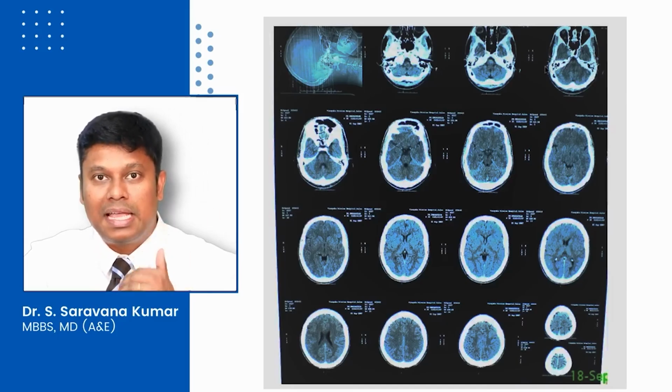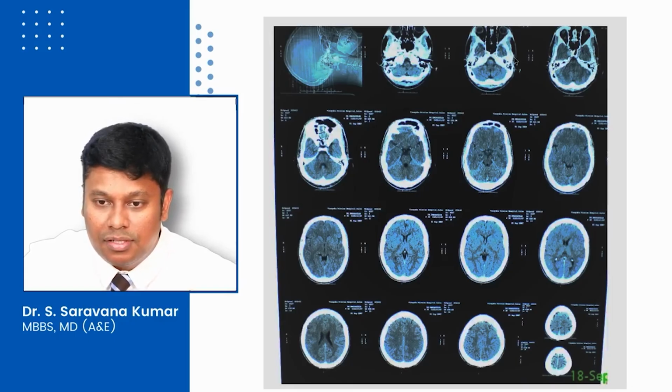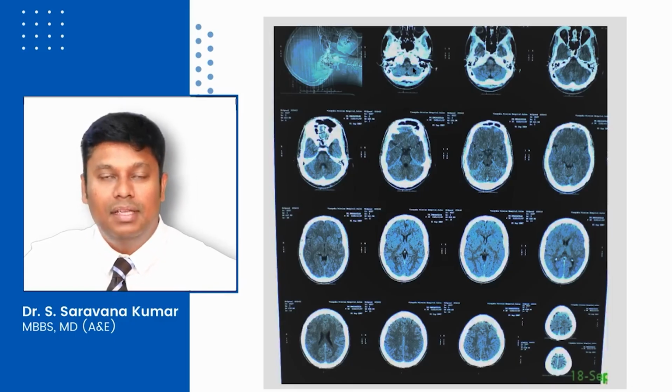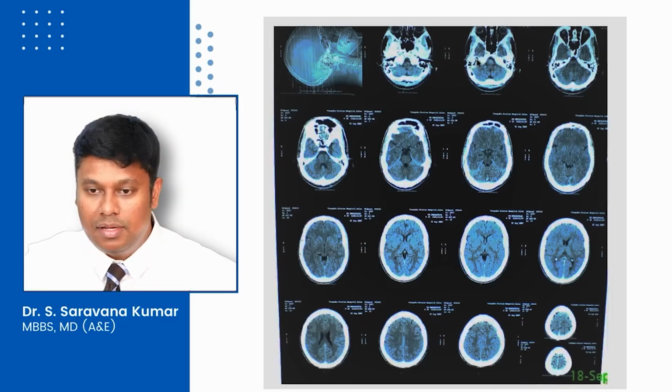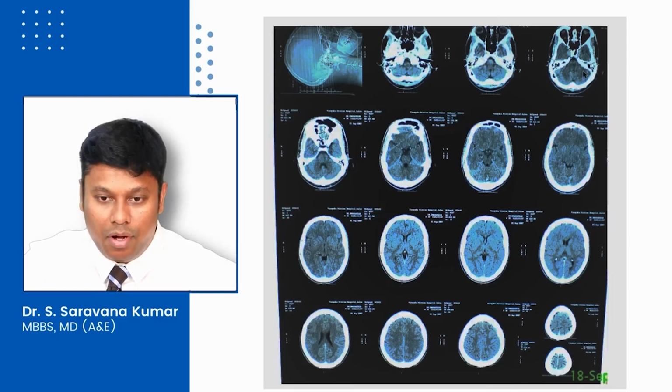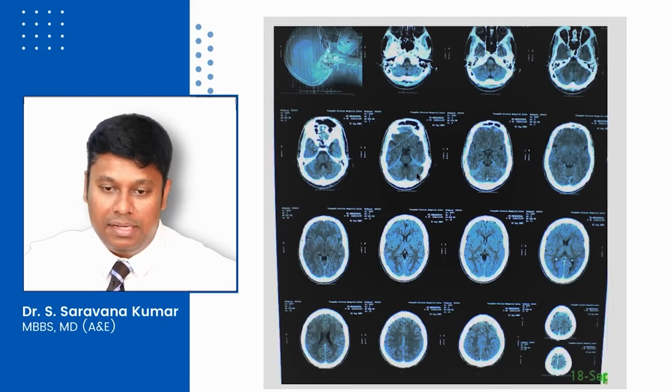I told you the scan is going from below upwards. So what do you think these two structures here, the one in the middle, which part of the brainstem is this? Yes, it is medulla. So you're starting with medulla. You have medulla, and as you can see on the screen, this image shows pons, and as you go up, you go to the midbrain structure.